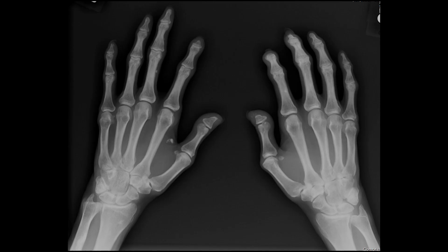So this is PA views of bilateral hands on a different patient with the same condition. And we again see some soft tissue calcifications, though not as much as on the other patient. But something interesting that we see here is that first we have acrosteolysis. So several of the distal phalangeal tufts that we see here in bilateral thumbs, the index finger, and little finger, there is resorption of the distal phalanx, and that is called acrosteolysis. And the other really interesting finding is there is not really that much soft tissue around the bones of the finger. Soft tissue resorption and atrophy.